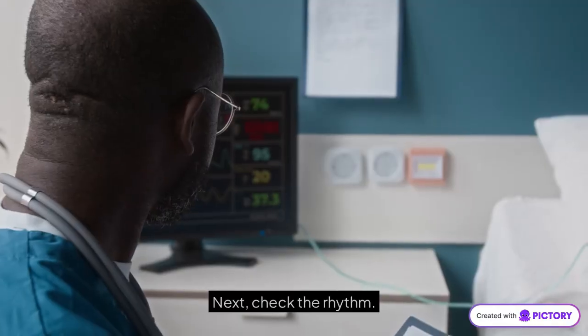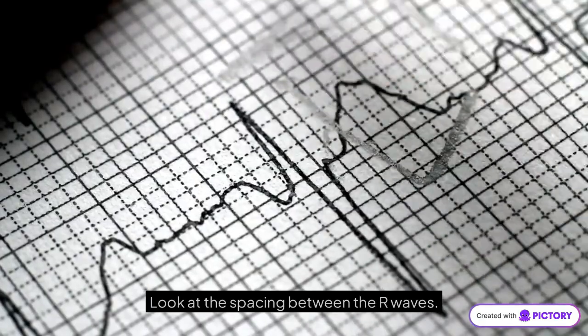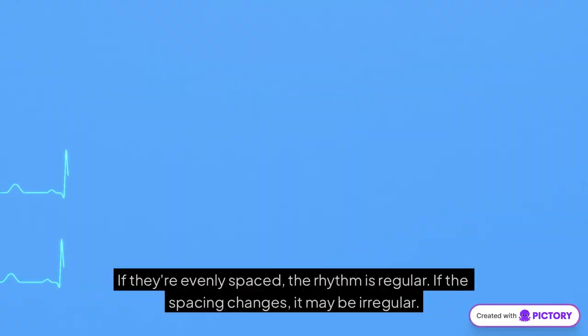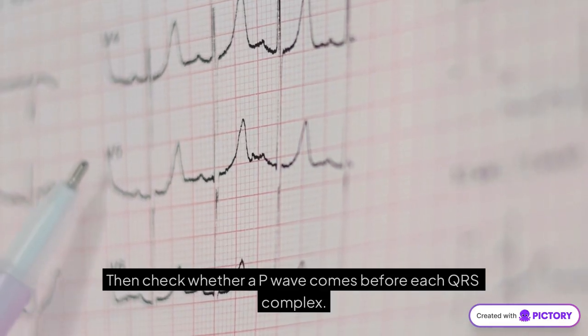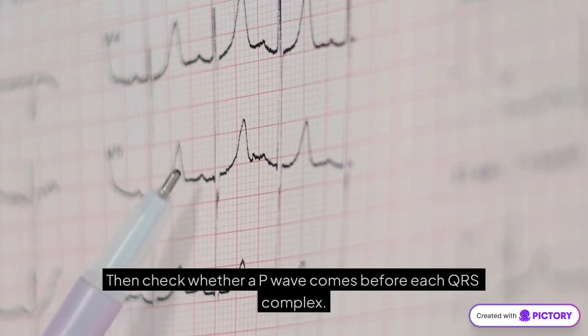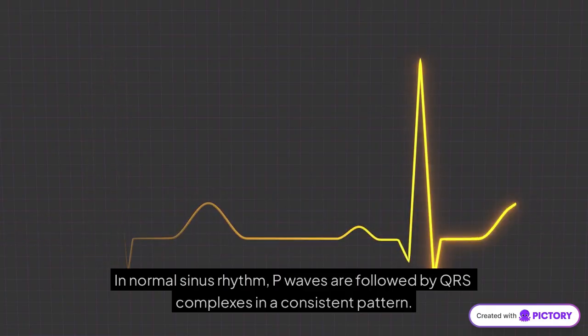2. Rhythm next. Check the rhythm. Look at the spacing between the R waves. If they're evenly spaced, the rhythm is regular. If the spacing changes, it may be irregular. Then check whether a P wave comes before each QRS complex. In normal sinus rhythm, P waves are followed by QRS complexes in a consistent pattern.